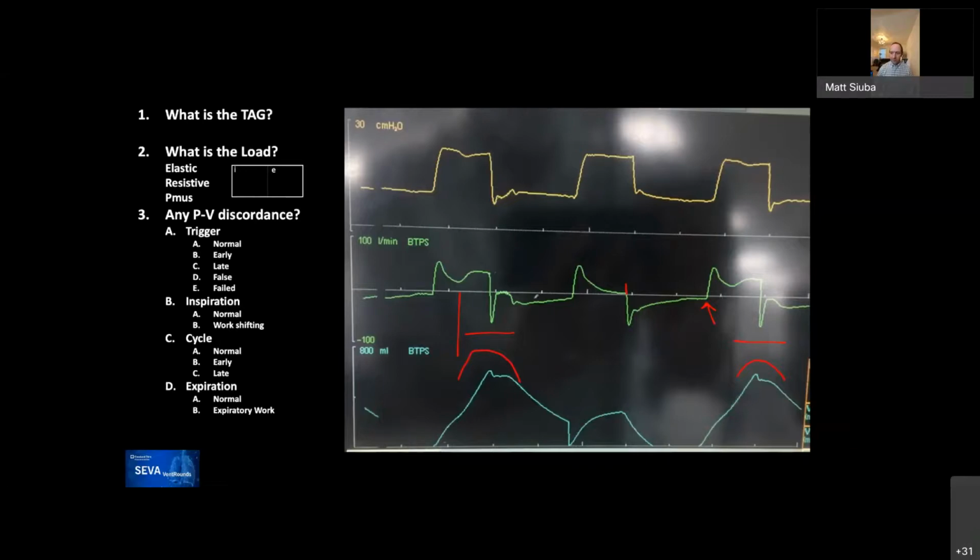And since we're talking about expiratory waveforms, what we're seeing here is continued inhalation during the first part of exhalation. So that tells you there's a cycle dysynchrony. It doesn't tell you what it's from, but it tells you the machine cycled before the patient was ready to be done with the breath, because of the phase delay of the PMUS compared to when the vent fired. Yeah, it's interesting that you can have multiple synchrony problems, one causing another. Yeah, absolutely.